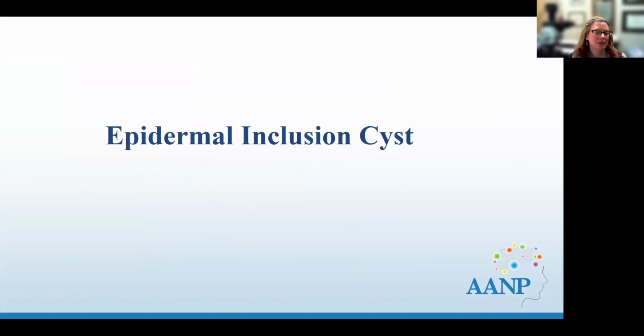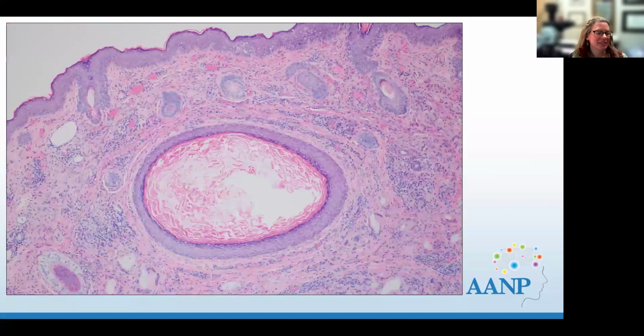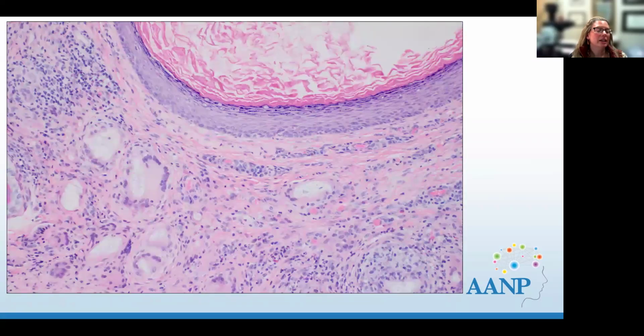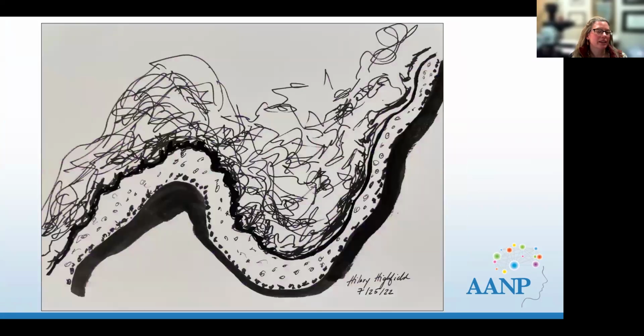And then of course, epidermal inclusion cysts. I have way too many slides for this because it takes a good picture, but you'll see this very, very often. So I'm literally gonna flip through these. Here we go. Because everyone knows these. Often they'll have a granulomatous reaction next to them when they burst. And so there that is with the keratin inside. If you get a cyst with keratin in your differential and you haven't found one yet, then keep cutting deeper because that's another thing with that communication. You'll often run into a cyst that is not present on the surface.